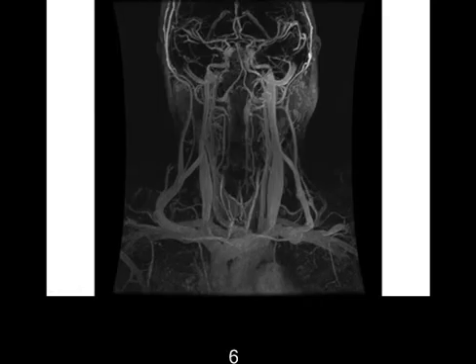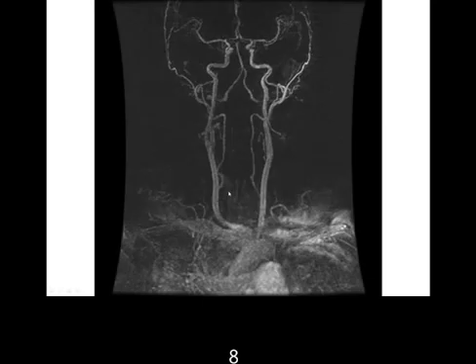Here is an MRI arteriogram and venogram together. This combined picture is quite busy, with a lot of vessels. The patient is looking at us, with the patient's left ear and right ear shown, and the eye not shown. All the blood vessels are shown here. For example, the first picture is the blood coming into the arteries. You can see the left side and the right side of the arteries supplying the brain, the big ones. The smaller ones are the posterior fossa vessels. They also supply the brain, mostly the cerebellum and occipital region, the vision area. So anyways, it looks pretty good.